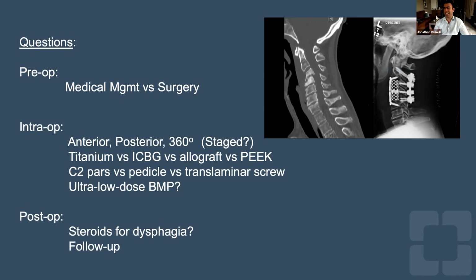I think if the plate is going to cause dysphagia, it's the exposure and the traction on the esophagus and the upper levels at C2. I mean, look at this plate. It's flush. You can't put it more flush than it is. It's the exposure for sure that causes the dysphagia, and you know, it resolves, gets better, and goes away.